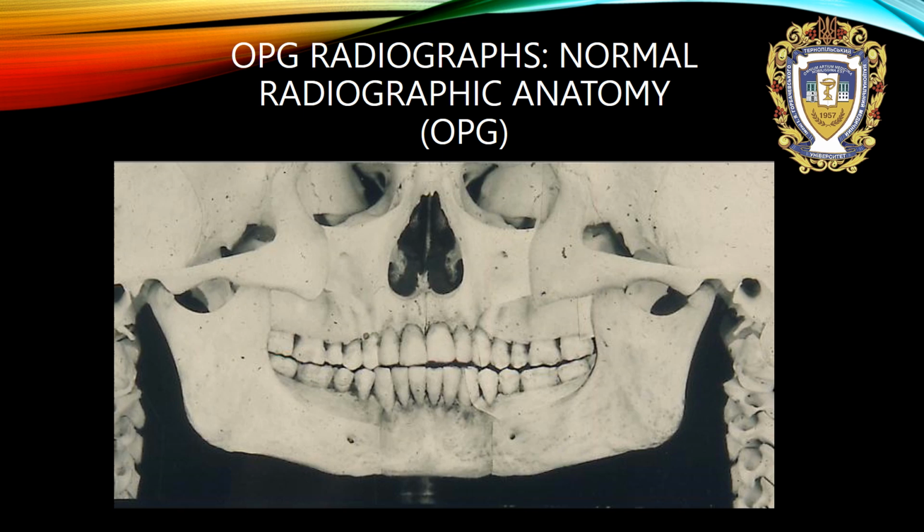Here is shown what we will see on panoramic X-ray. It is a volume object, a 3D object, in 2D imaging.